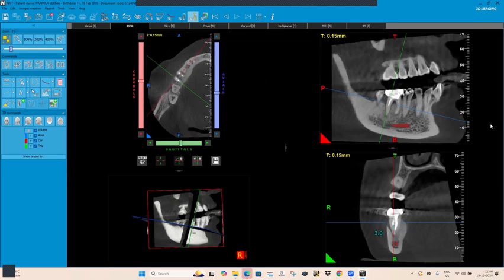And there are a lot of queries from the postgraduate students regarding this, because there are a lot of cases going on the same subject. But we are unable. The way we are able to calculate the volume of the sleep apnea cases, the oropharyngeal airspace, can we calculate the pulp volume in a similar way, because for endo the pulp is important.